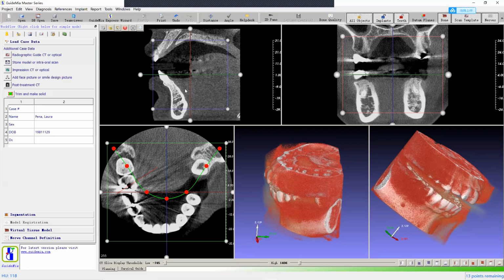That changes. So if we look at the lower corner of my screen, now it shows HU minus 179, right? That's the Hounsfield unit of the CT pixel. For each pixel, we have a value. Typically, it ranges from minus 1,000 to a couple of thousand.